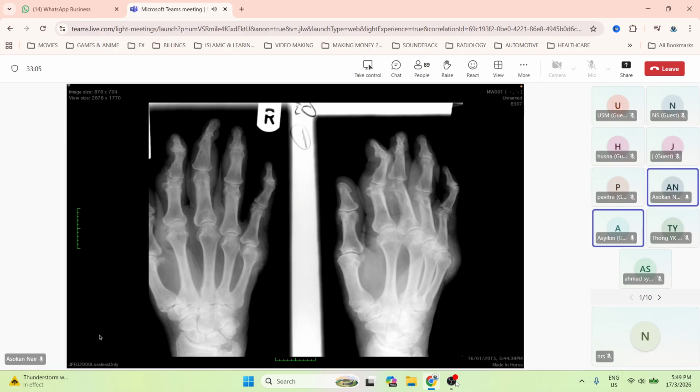No, no, okay. I'm trying to tell you this because sometimes in the exam there's no differential diagnosis. This is typical, almost pathognomonic of gout. You should be confident enough to say this is the appearance of tophaceous gout or gouty arthritis with tophi. There's no other diagnosis that fits this.